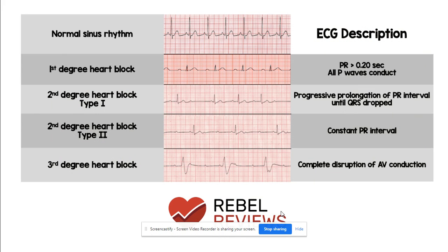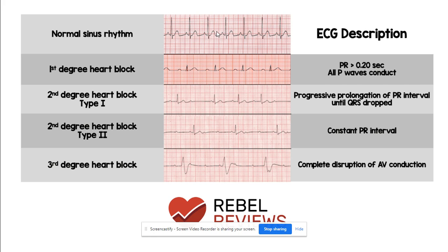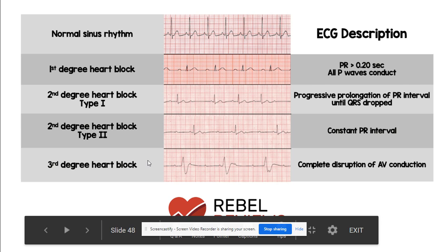All right, so here's a comparison. This slide might be helpful for you to print off or even maybe draw on a flashcard or even create some digital flashcards, but it compares the first, second type 1 Wenckebach, second type 2, and then the third degree.